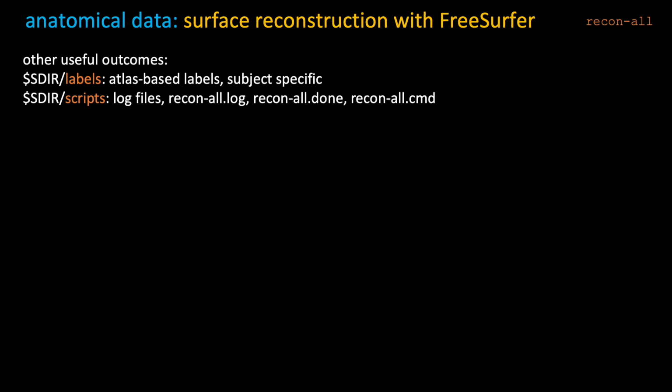You can even find the dump of all the environment variables that were set at the time of running these commands. So it's a really great place to start debugging if you have any issues, or just learning what the recon-all was doing under the hood while you were not watching.